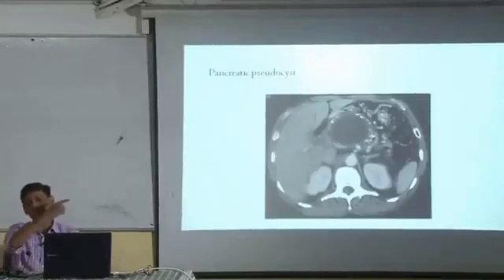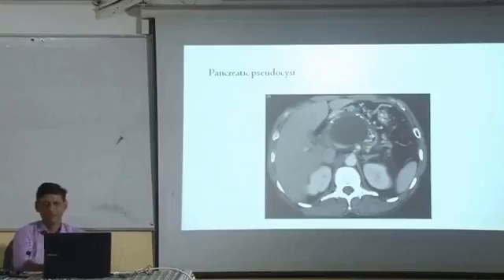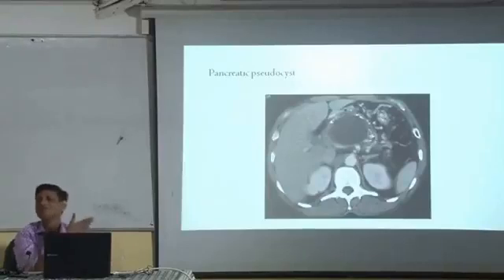This is a CT of pancreatic pseudocyst. This picture also they show because you did not have the question there. I thought it is better that you see it. You can see the pancreas, you can see the calcifications also here. And this thing that you are seeing here, you can take the slide after the class. Don't worry about taking the pictures. Take it with you. Okay? There is no secret in it.